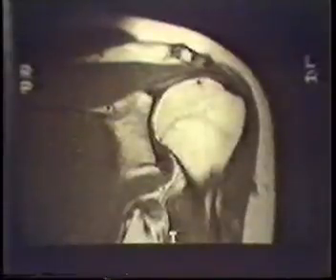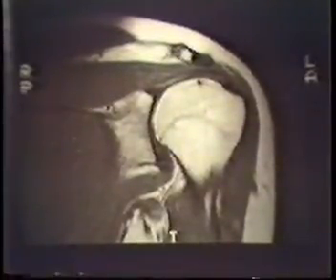This is the level of the distal clavicle, and the acromion dips down too low here, and therefore there's less space. Notice that there's no fat plane, which you said was normal before, above the supraspinatus muscle and tendon. Or the patients can develop tremendous callus at the AC joint. And the callus can dip down and impinge upon the superior aspect of the supraspinatus muscle, as you can see in this patient on the right. Again, loss of the fat plane.